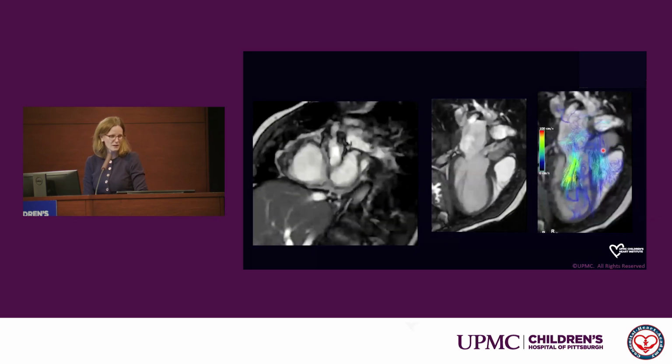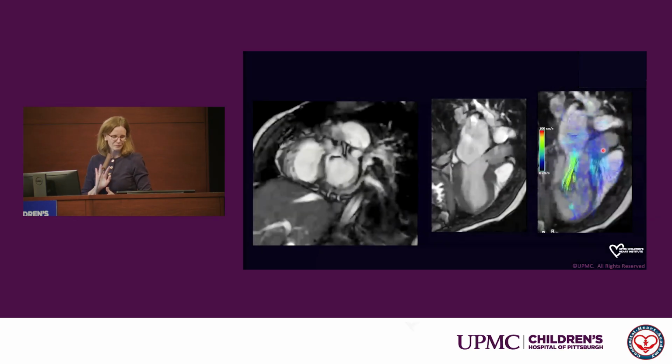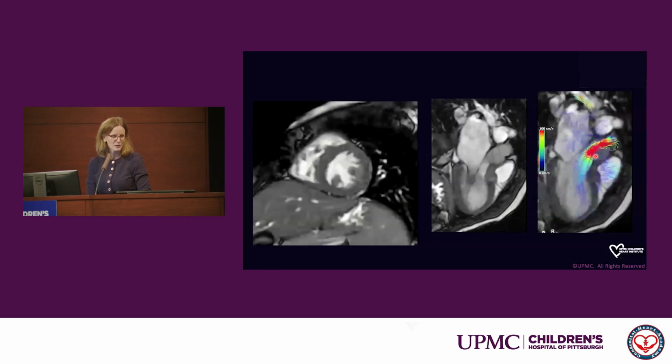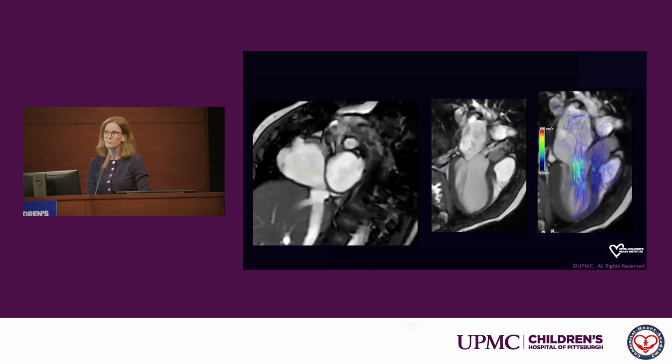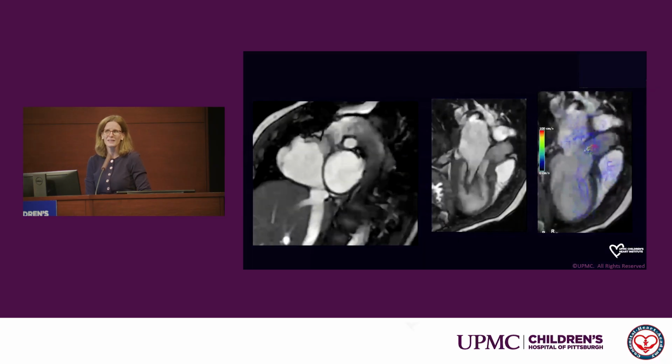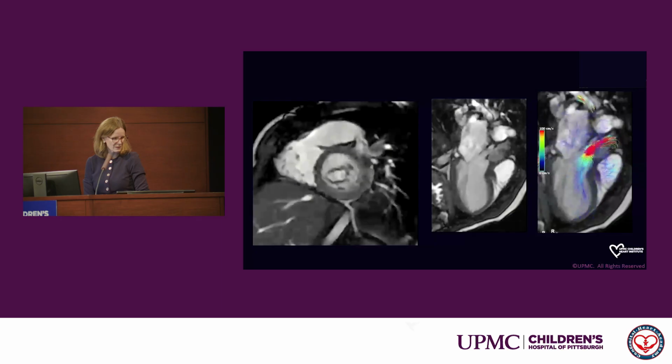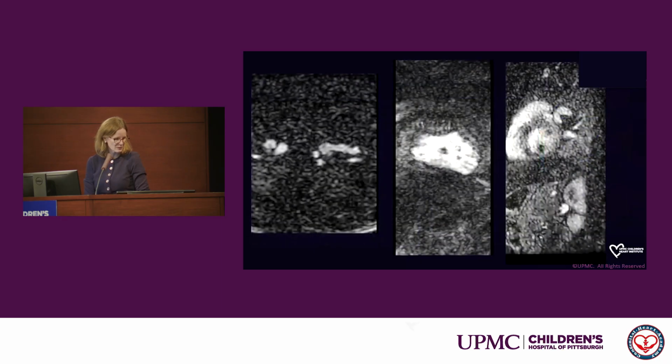And then this is with some 4D flow superimposed upon the cine where you can see this red flow acceleration starting below the aortic valve. Not a lot of AI, in fact almost no AI, which is nice, but definitely fibromuscular subaortic stenosis with LVH.